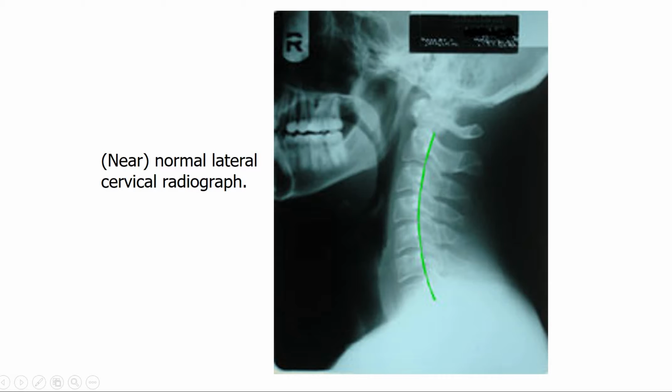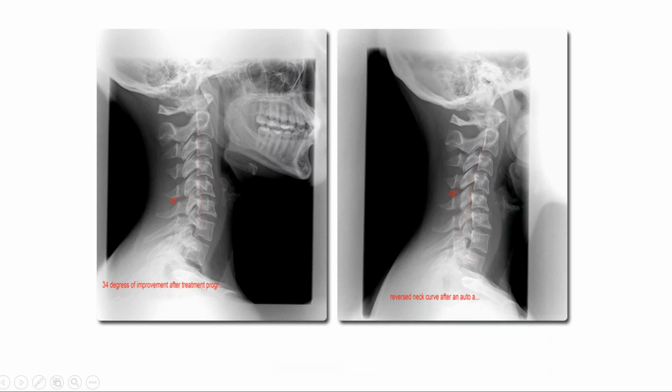Okay, so here's a lateral, which means a side view x-ray of a person. So here's the jaw, teeth, there's your skull, cervical spine. So this is basically showing you what a normal x-ray looks like. Look at the disc height here. Okay, these black spaces, that is the intervertebral disc. The white stuff that you're seeing that almost looks like cubes, that's the vertebral bone. Okay, back here, these are the spinous processes. So we're looking at a neck here, a normal cervical radiograph.